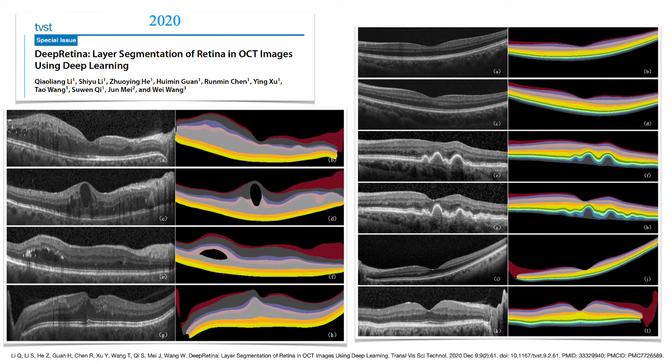So nowadays, using deep learning and AI, there are some external softwares that provide thickness of each of the retinal layers, but what is extremely interesting is that this thickness is also provided in pathologic eyes.